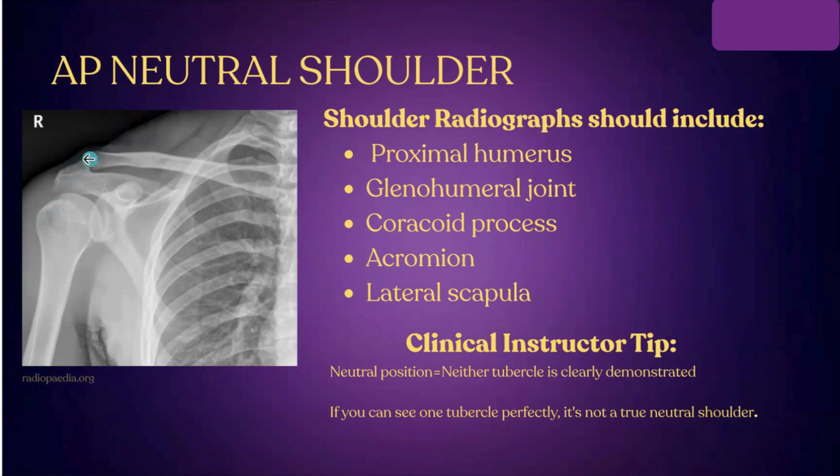Make sure with this that you have the entire shoulder anatomy. We can see all of the bones and the detail here, and we can see all of the shoulder anatomy, but just make sure you're including a little bit more of that soft tissue anatomy as well.